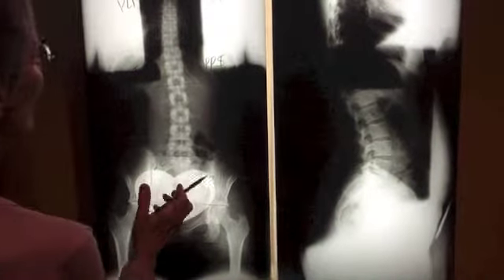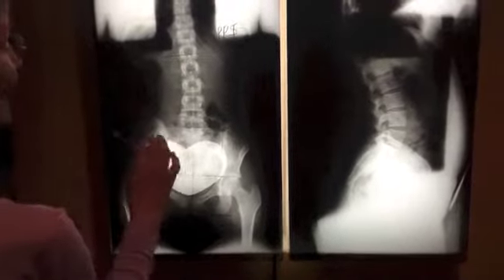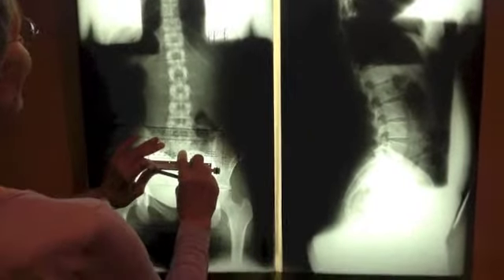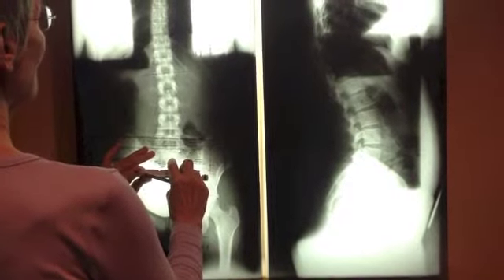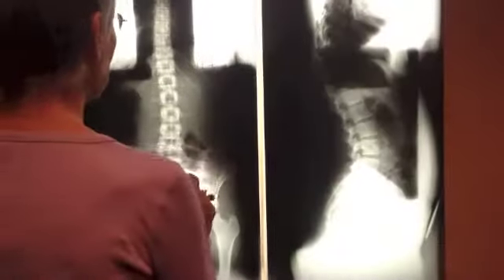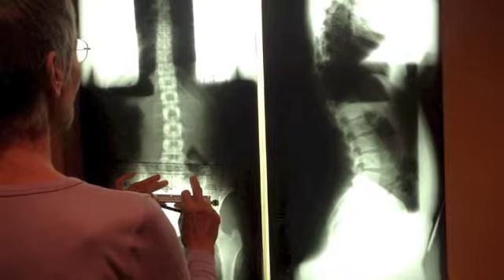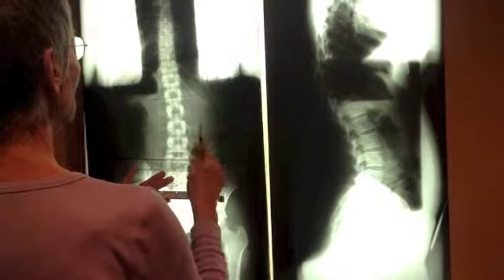So if we look at the fifth lumbar, you want to see, is it sitting at an angle or is it parallel with that? So it's slightly off. You can see it by checking the base of the pedicles, by standing back and just looking at it, coming back in, checking two other points like the top of the vertebra or the bottom. And it's difficult. It's an art to it.